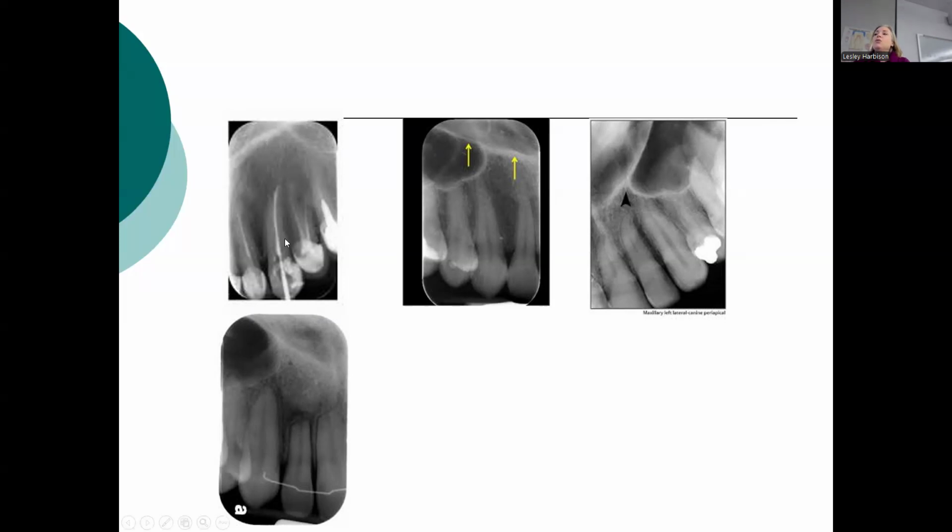But again, no matter what you're looking at, you have some clues. So like back here, you might say, "Oh my gosh, there are crowns on all these teeth. How would I be able to differentiate?" But generally speaking, this tooth looks a little bit smaller than this tooth.